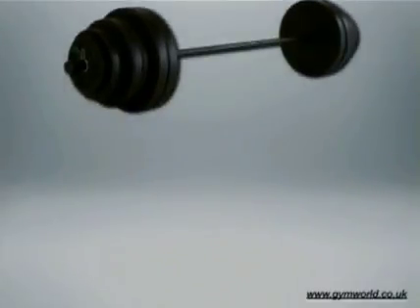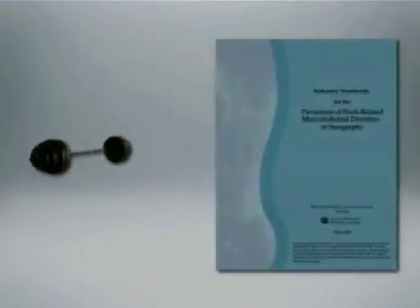Now, lest you think that I'm being wimpy and saying, I don't want to lift a transducer like this and use it for a long time, this is a real ongoing issue for sonographers who scan all day long. And the SDMS has taken a lead in looking at the ergonomic-related risks, including size of transducers and weight of transducers on sonographer work-related injuries.